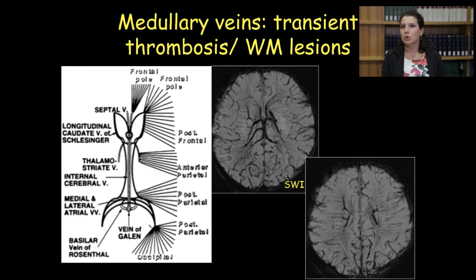We have already spoken about the periventricular ischemic stroke and about the suffering of the medullary veins. The periventricular ischemic stroke was related to the hemoventricle. In this condition, we can say that it's not always evident to see the presence of thrombus inside the vein.